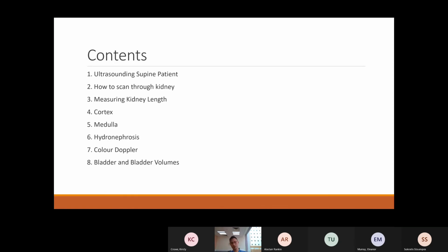We're going to talk about how to scan through the kidneys, measure the kidney length, and we're going to talk about assessing the cortex, the medulla, spend a bit of time talking about hydronephrosis, and also talk about color Doppler, and lastly, we'll spend a bit of time talking about bladder assessment. Throughout the lecture, I'll be showing you a few case examples, and I'll appreciate some audience participation during that time.